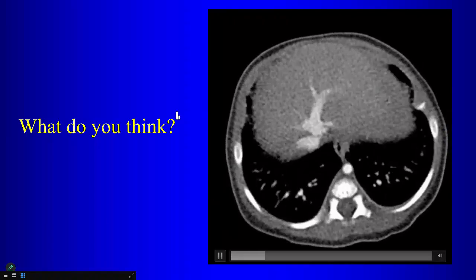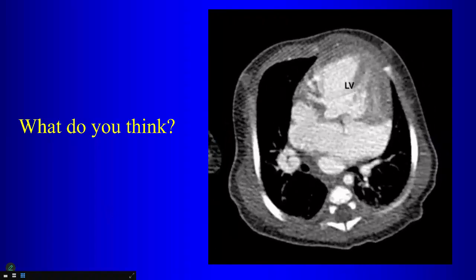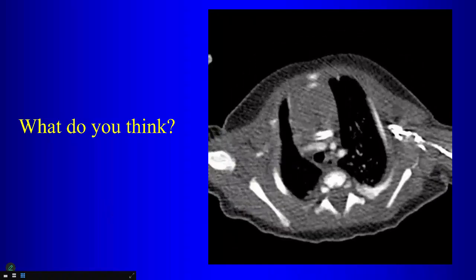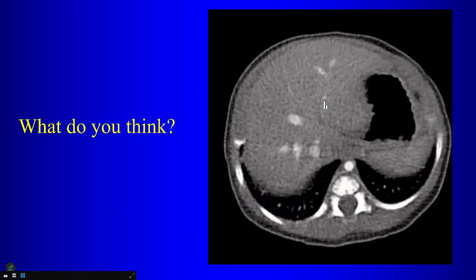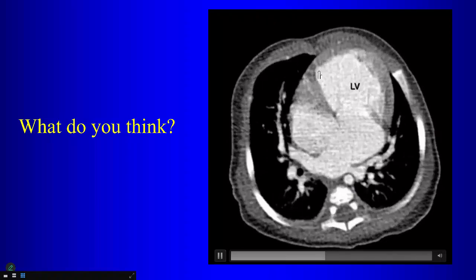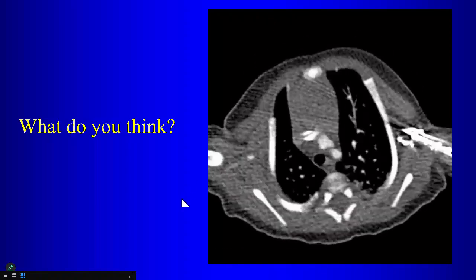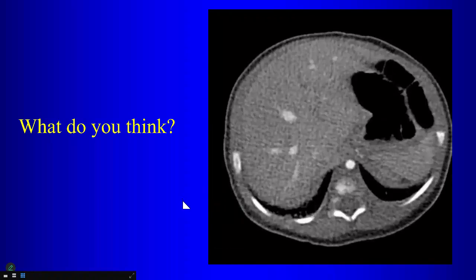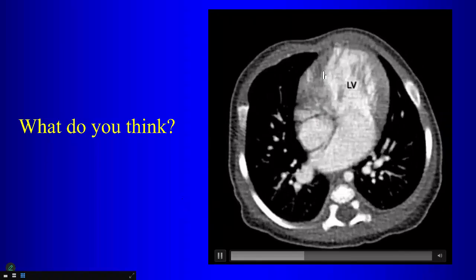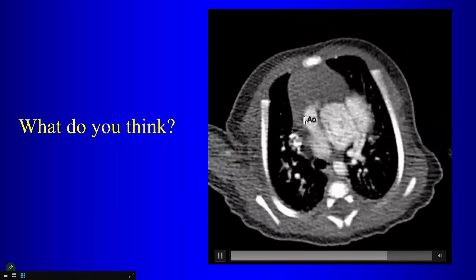So what are we looking for now? Right ventricle. Where is it? Here. Did we see it? It's really small. It's very small. Right? And by the way, there's a really small right ventricle in there, right? And what does the right ventricle connect to? Yeah, the right ventricle connects to the aorta. So a really tiny, small right ventricle connects to the aorta.